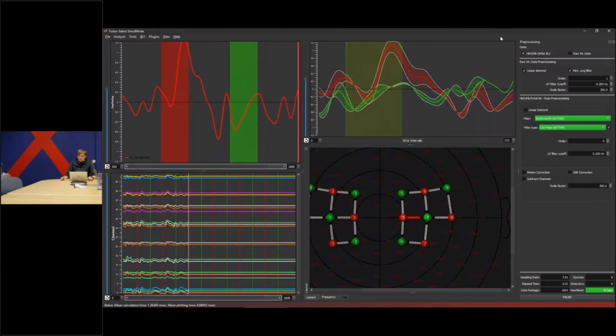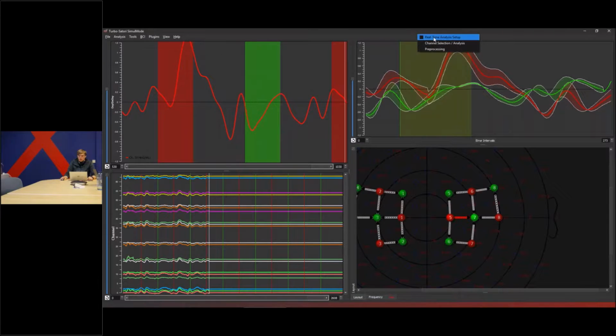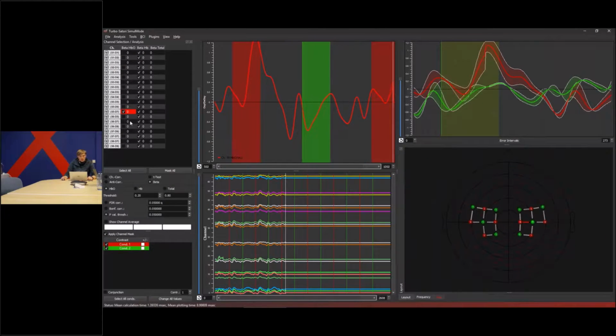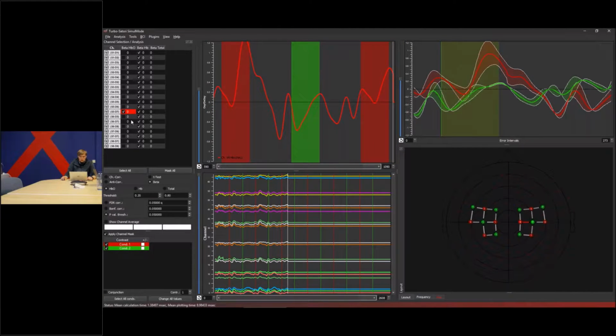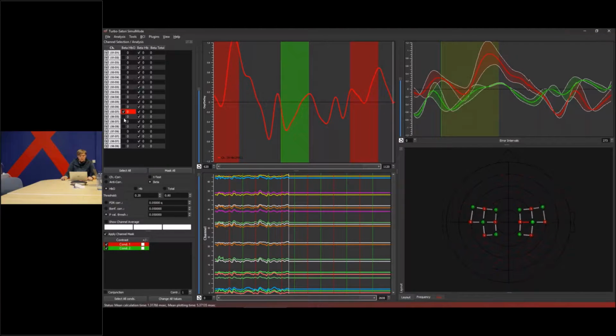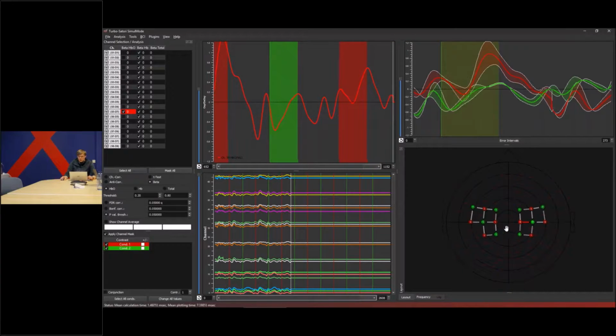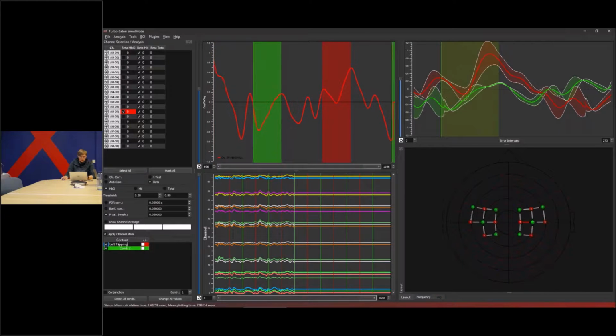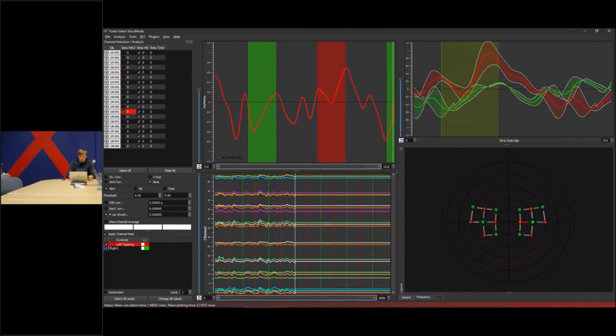So we just close this tab for now, and we go to the real-time channel analysis. So here on the left, you basically see the channels that you see also here. So you can also go into this part and select and deselect the channels over here. What we are interested in this setup is left and right. So we have two conditions. Condition 1, which was left tapping, and we have the condition 2, which is right tapping.